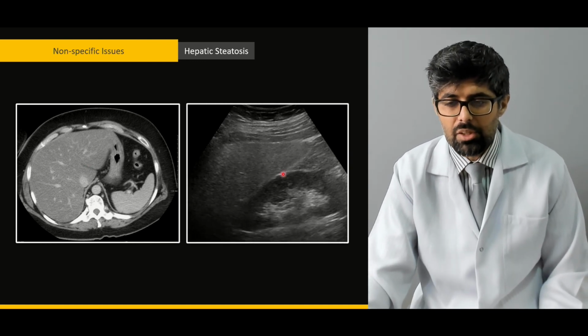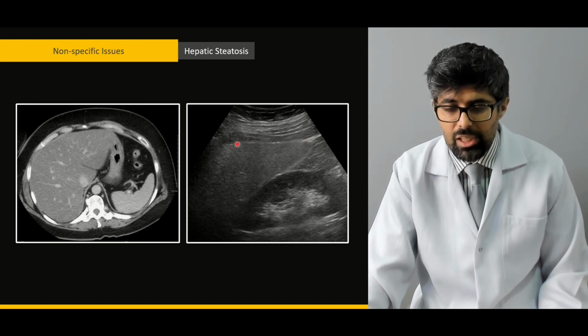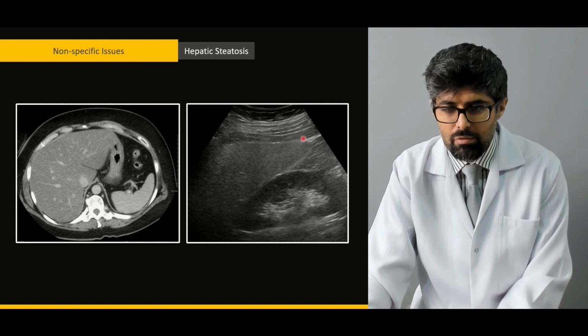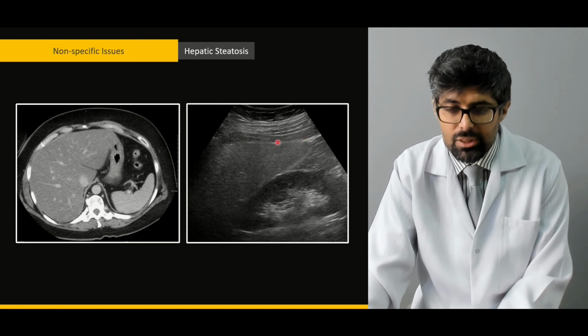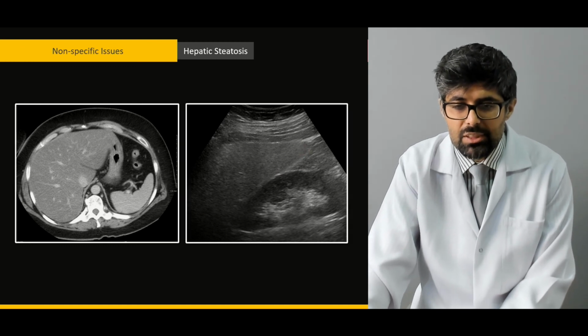This is another image of the fatty liver, where it has lost its isoechoic properties.